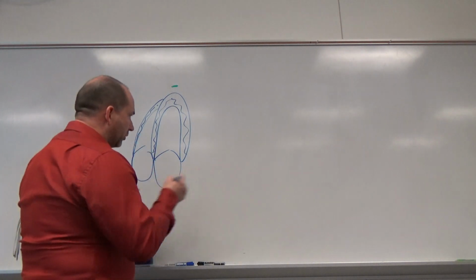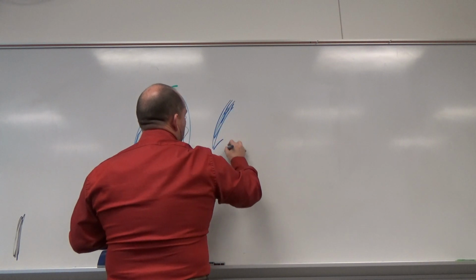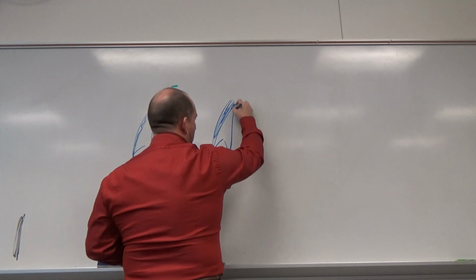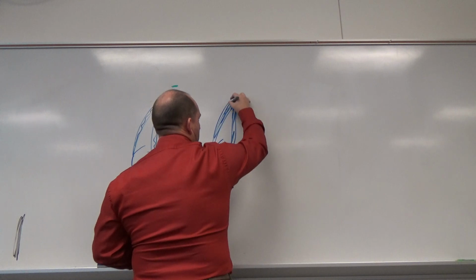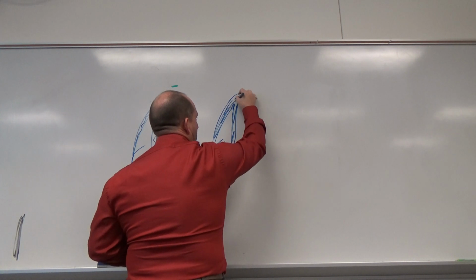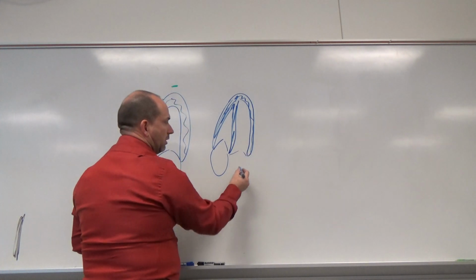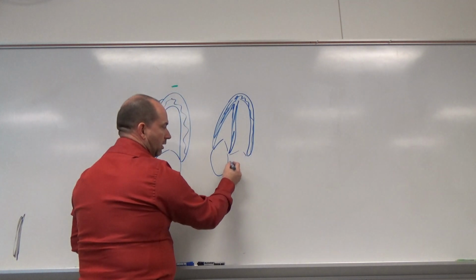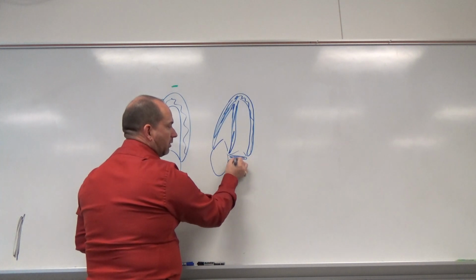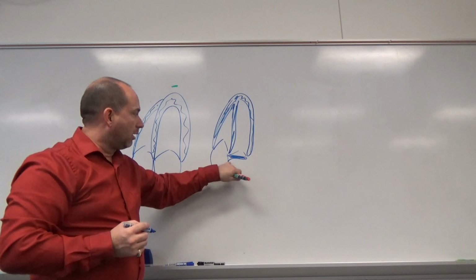Okay, so what do I see when it's mal-rotated? You might see ventricle, right ventricle here. Okay, you might see the right atria. It might be full and decent. And then you get the septum, comes around. I kind of see some left ventricle. I see some left ventricular chamber, maybe a little bit of valve here. And then for whatever reason, I don't really see anything back here, but what I do see is kind of an oblong fluid-filled space there. It's going to be black like the fluid in the chamber with some white and stuff around it.